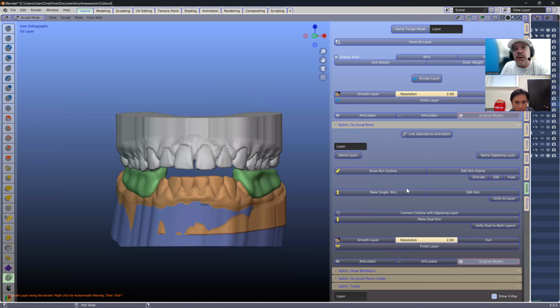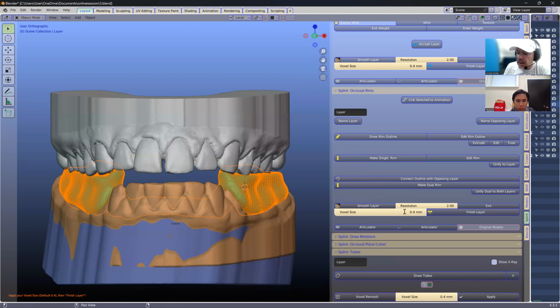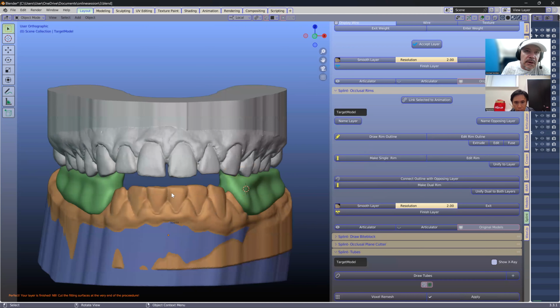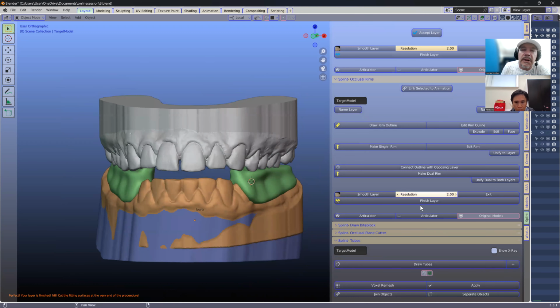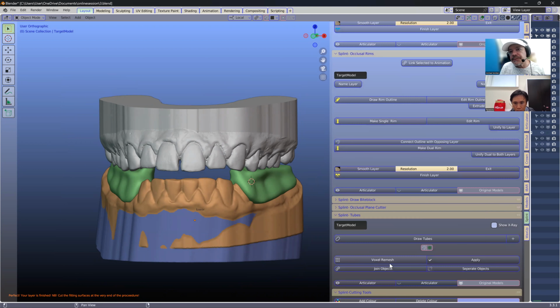So what we want to do is I'll just go exit. When you click exit of the smoothing, it remeshes it, to make sure we've got a nice mesh structure. Between 0.3 and 0.4 is a good mesh structure. Now we want to make a Boolean cut in the actual surface. Go down to the bottom of the cutting tools.